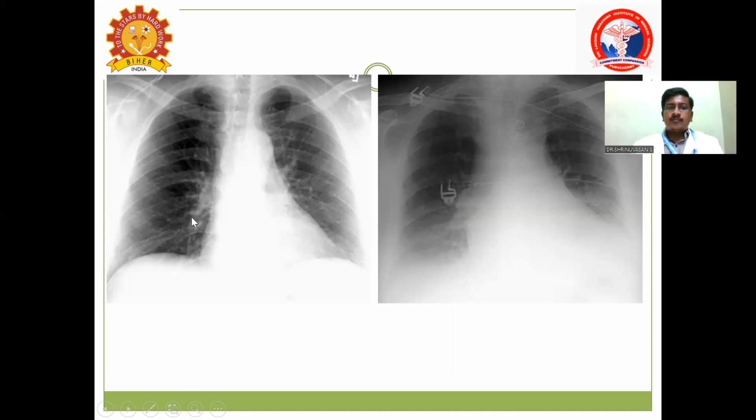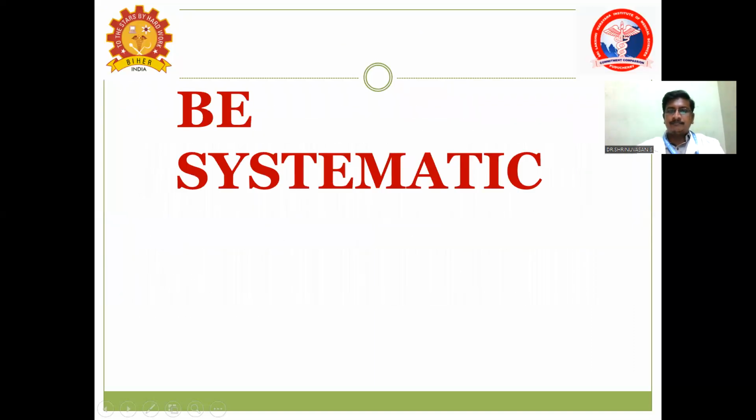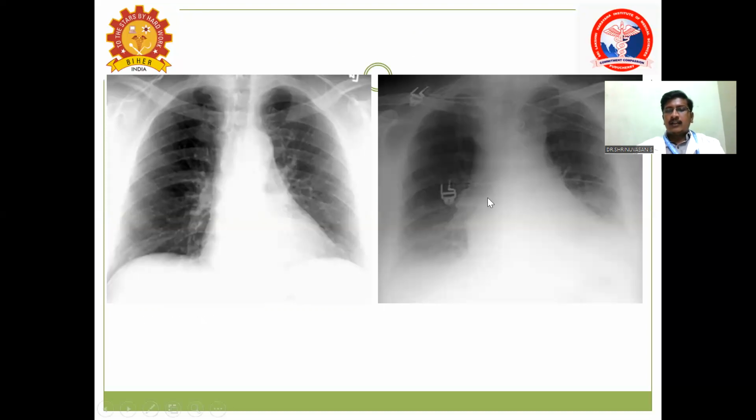And you can see the scapula, because of the position, moving away from the chest wall. But here you can see the scapula is towards the chest wall or included in the chest wall, and you can see the exaggerated heart, because in mobile X-rays we take the film close, and we see exaggerated magnification of the heart. So we cannot assess the heart size in this.